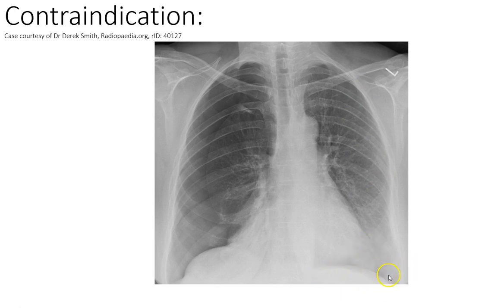Less crisp on this side, and we've lost it at the bottom. Now we look at the heart, and it's a bit less clear, but we're seeing some on this side and some on that, but the majority on the left, and it's about half the diameter of the lungs.